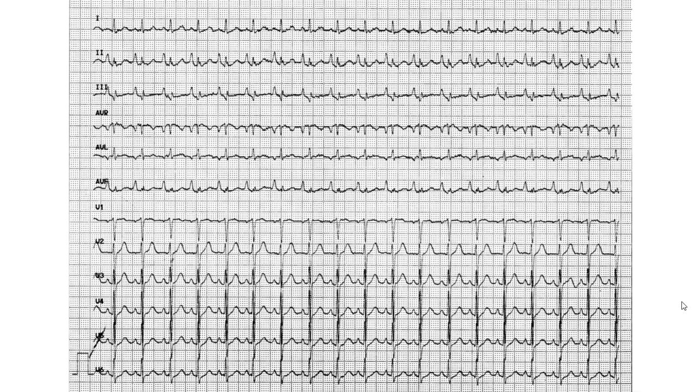Okay, so this is question 6. We'd like a bit of time to work on that. So, question 6. What can you tell me about it? I recommend going through this one. If you haven't been doing it, pause a bit and try at least the first few points. It's all practice.